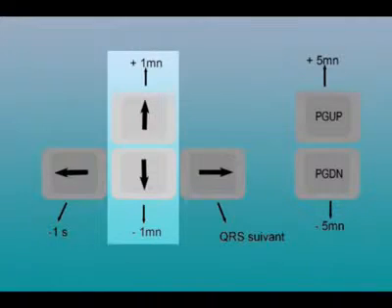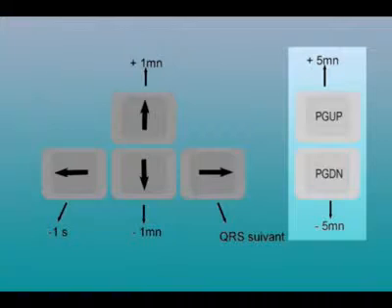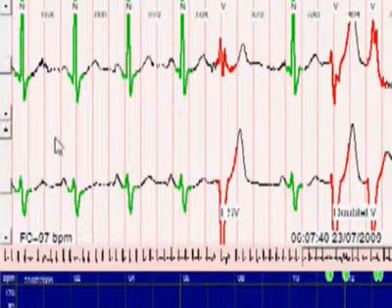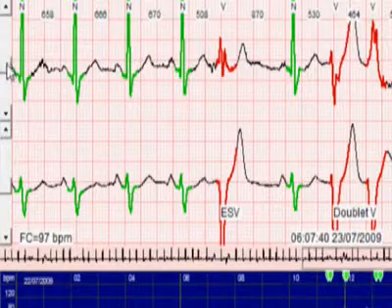You can quickly scan a period of time by simply looking at the miniature line and clicking on any passage that appears to be interesting. The page up and down buttons are used to go forward or backward 5 minutes. The ECG can be set at different levels. Adjust the vertical position of each channel.